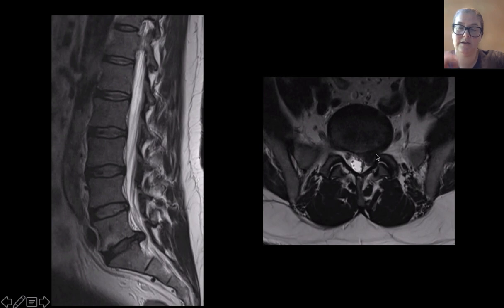It is a herniation. Now, can I tell them, is this an extrusion? Is it a protrusion? Is it sequestrated, or a sequestration? If you look on the sagittal images at the base of the disc, it's definitely narrower than at the dome or the larger part of the disc. So I probably call this an extrusion. On the axial, it looks more like a protrusion. On the SAG, I'd say probably extrusion. Again, I really don't think that part is hugely important, just that you understand there is a difference, so that you can decide yourself and have some internal consistency.